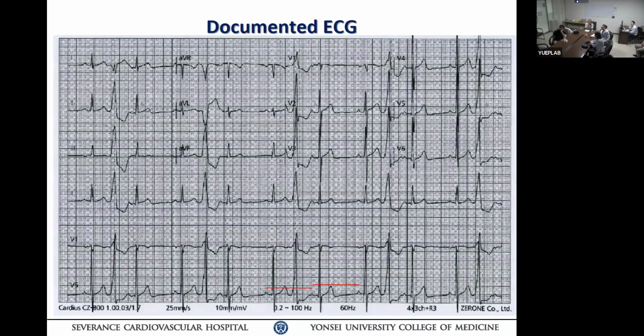Okay? So sometimes the ECG tells you only the exit site, and if you want to do ablation, you've got to have a somewhat broader differential diagnosis to make sure you prepare for that. And this two French catheter probably would be helpful. Did you guys put the two French catheter in the cardiac vein and ablate this? Did you use the cardiac vein two French catheter to map this?